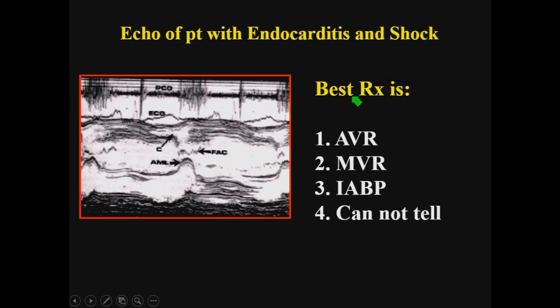Well, I'm looking for several things. And always look for the electrocardiogram. This is helpful. This tells you what is systole and what is diastole. This patient even has a phonocardiogram. This is another technology that we don't use anymore unless you use your ears, if you wish, right? But this patient has a diastolic murmur, right? But now let's look at the mitral valve. This is the septum, this is the mitral valve, and you see that the mitral valve opens and the mitral valve closes here. Here?